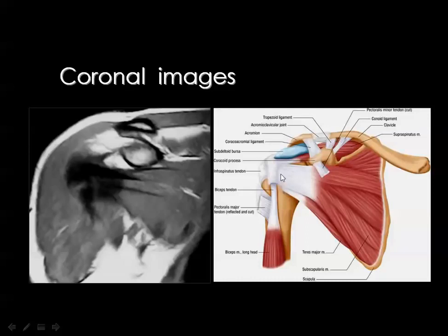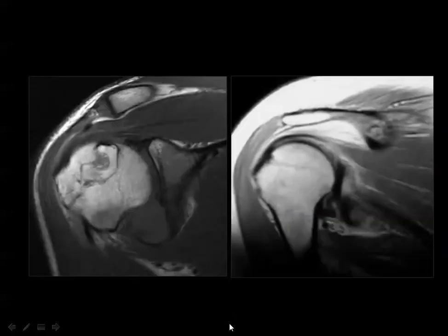This is the subscapularis tendon. It will insert into the lesser tuberosity, which is intimately related to the tendon of the long head of the biceps, so that many of the injuries affecting the subscapularis tendon will affect the tendon of the long head of the biceps muscle.